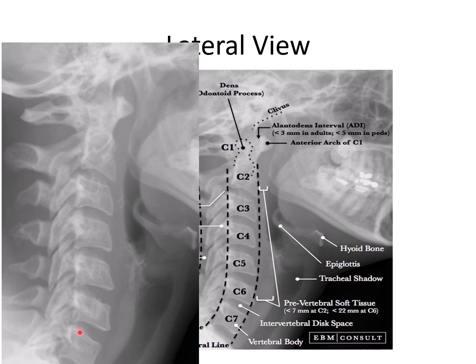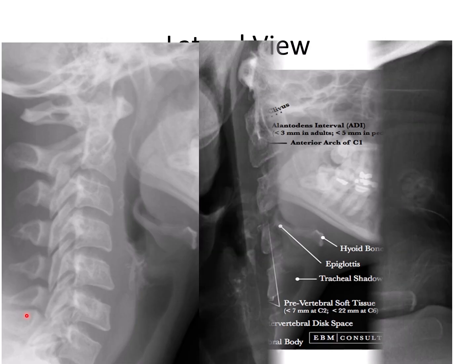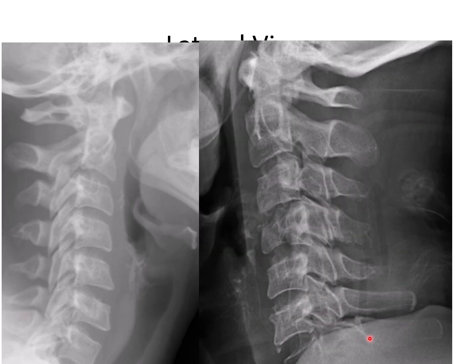Among the vertebral bodies, C7 is prominent, so the spinous process of C7 is larger than all other cervical vertebrae, so it is used as a landmark. As we can see here, C7 is the largest, so it is long and prominent.